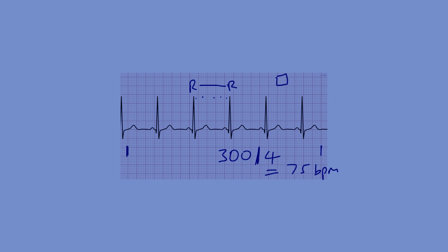And when we count, what we then do is count how many QRS complexes are taking place from the beginning to the end.